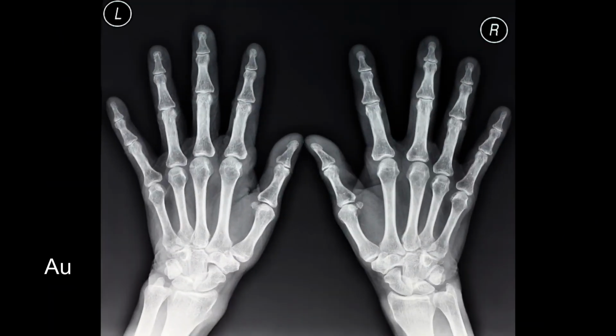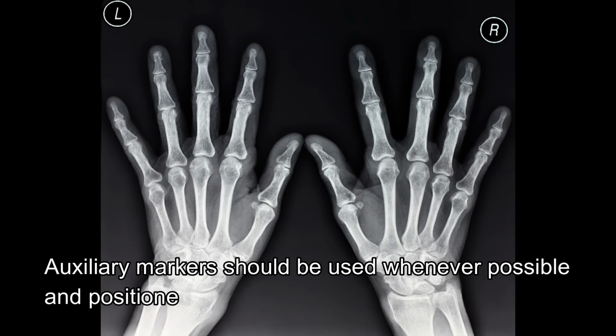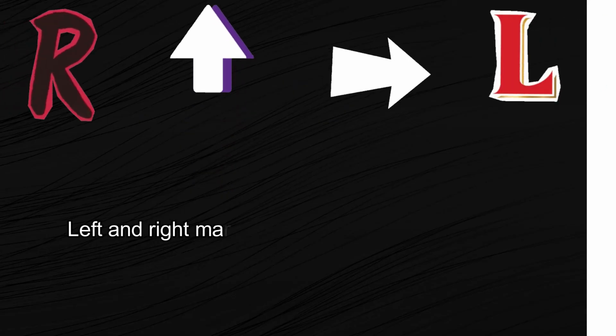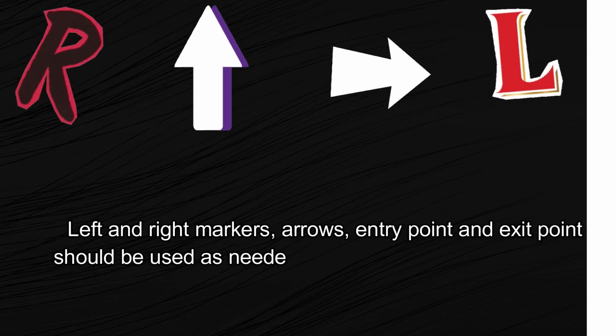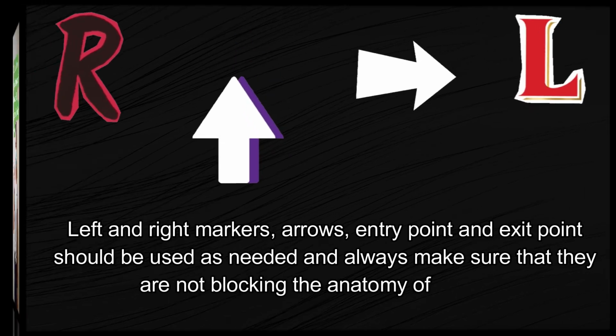so that the lateral side of the body that is fractured or needs to be examined is either the left lateral or right lateral projection and the structure of the body being focused on when processing the radiograph. Auxiliary markers should be used whenever possible and positioned away from the critical anatomy. Left and right markers, arrows, entry point and exit point should be used as needed, and always make sure that they are not blocking the anatomy of interest.